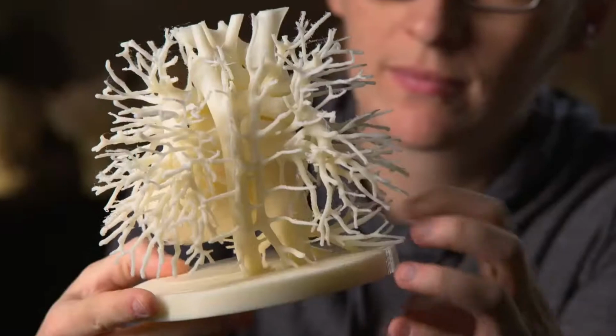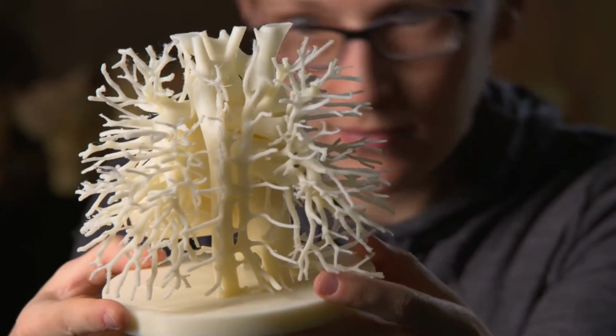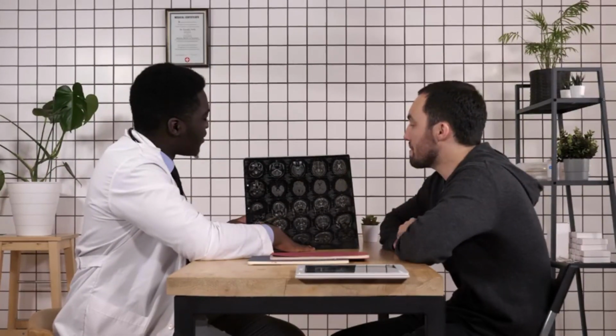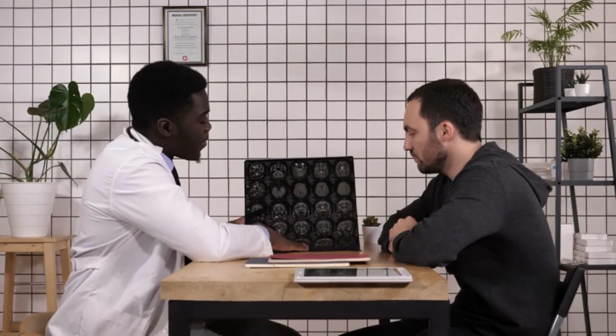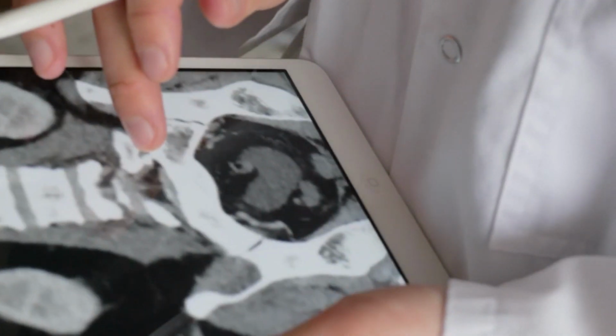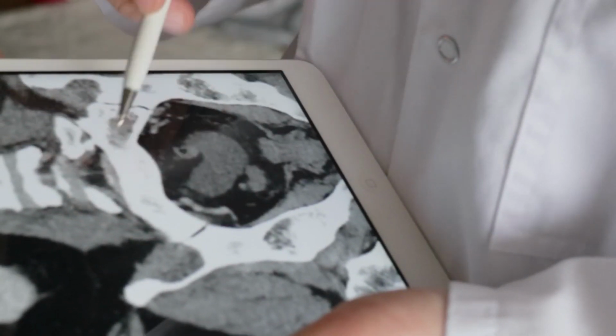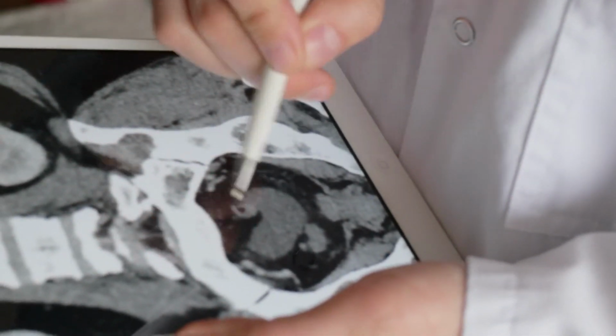Animations and 3D models help us learn what organs would look like if we saw them during an operation. But nowadays, healthcare providers see organs much more frequently using indirect means, such as with advanced imaging technology. We'll start by reviewing the four most common means of seeing internal organs. Then we'll demonstrate what organs look like using these methods.